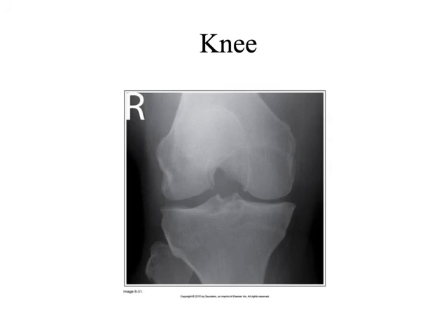This is an image, if you're interested in MRI at all, this is an image to become acquainted with, because this is one of the ways that we look for certain MRI images, right? Is having something that looks similar to this intercondylar fossa knee X-ray.